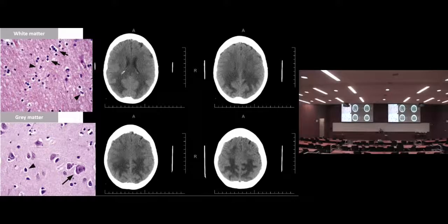And what do we have here? Here we just have some examples of edema.